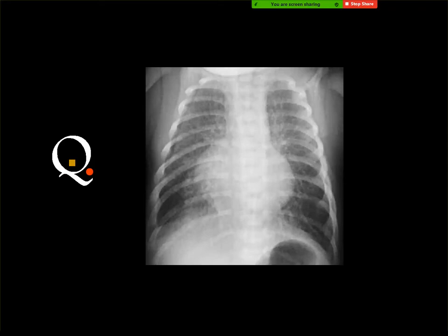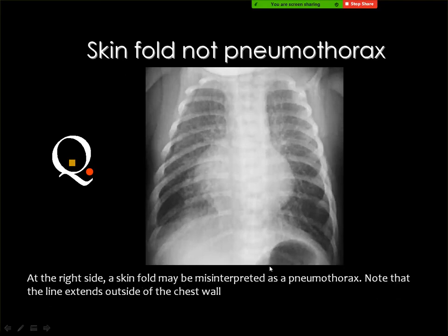Hyperinflated, let us say. But do you see this line? What do you think? Minimal pneumothorax. Okay, and this image is provided here because of this. In neonates, whenever they are obtaining a chest X-ray, there may be skin folds, and these skin folds may be mistaken for a pneumothorax. The best diagnostic clue is that you can see the fold extending outside the chest, and this means that this is a skin fold and not a pneumothorax.